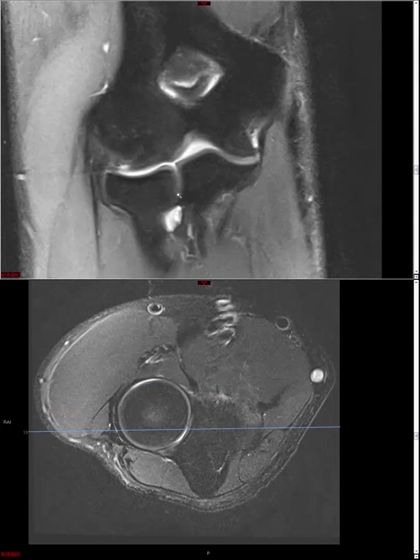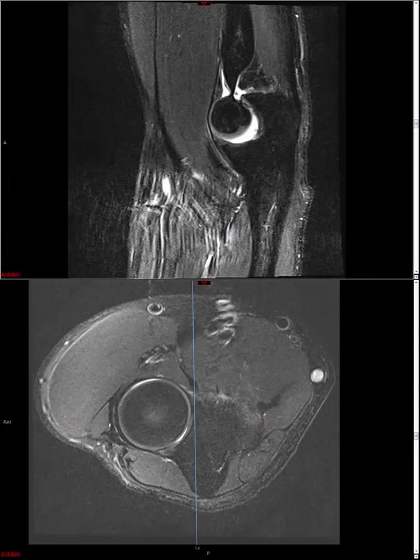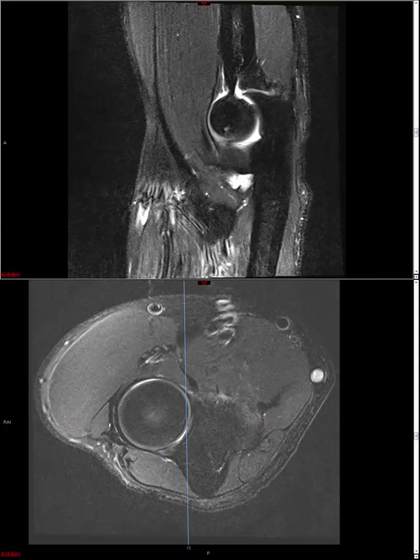Alright, there's also a proximal radioulnar joint as well, and so it's important to remark upon the cartilage in that compartment as well. And then just look for an effusion, so on and so forth. If you believe there is a joint-centered process, then of course that will be an extra half a paragraph or a paragraph in your dictation. Okay, so we looked at the common flexor extensor tendons, collateral ligaments, we looked at regional tendon attachments, and we looked at the elbow joint or joints, and it's around this time that I'll start looking at the nerves.